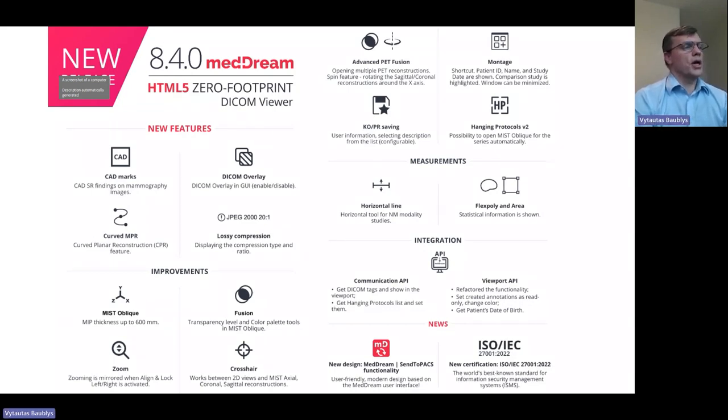I would mention now the most important for myself is CAD markers, which I believe the first request on CAD markers we received in 2015. And finally, they are fully functional available in our product. There is also fully functional curved MPR, which was also asked for since the beginning, when we created our product. There is also significant improvement on the fusion and all of the other functions which we will go through today.